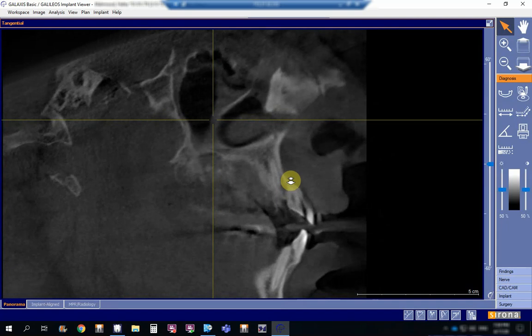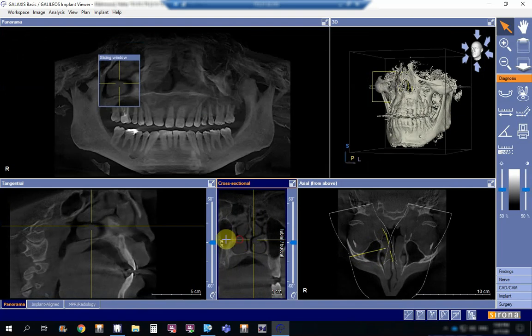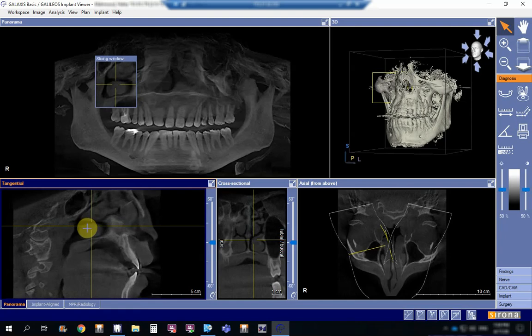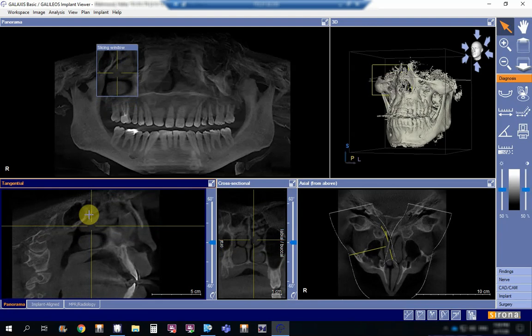medially. Now I'm in, this is the meatus, this is the concha. Okay, how do I know? I will know from here. See, where did I go? And this is how it looks. Now if I go inside, as you can see here, inside I have gone into the nasal cavity. This is the inferior concha, and this is the middle concha over here.